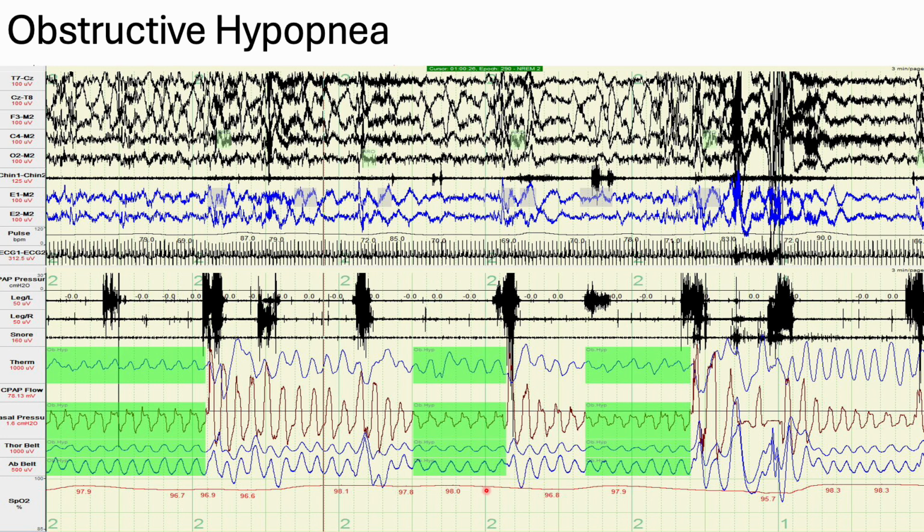They really don't even have any qualifying desaturations, not for those events. And I remember this study well. It was a middle-aged lady, she was normal, who wasn't showing signs of sleep apnea because she did all this. Because of all the arousals, I scored them all, and I ended up splitting her. And to both her and my surprise, on CPAP halfway through the night, it totally fixed her. Very strange-looking hypopneas, but you can tell that the airflow does go down significantly.